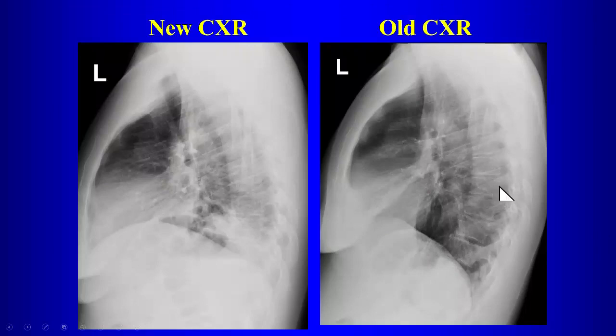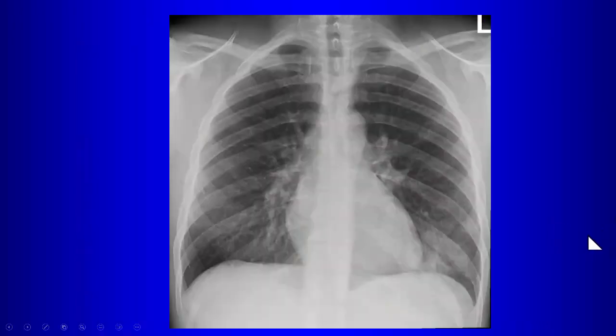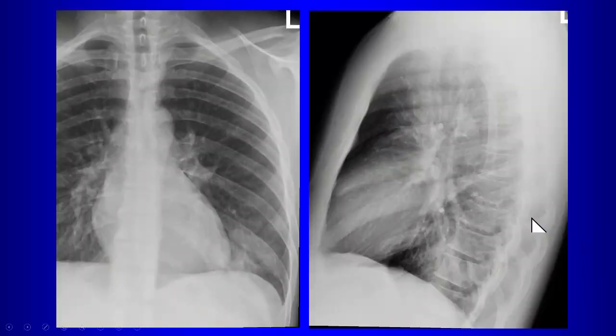No spine sign here. The film gets nice and dark as you travel down. So comparing that to that, wow, this is really a problem here. This is left lobar pneumonia. And then there's a frontal view, okay? Different patient, somewhat more subtle, but the same thing. Retrocardiac opacity, and as we travel down the spine, it's a little bit brighter there. Spine sign, it's another case of a left lower lobe pneumonia.